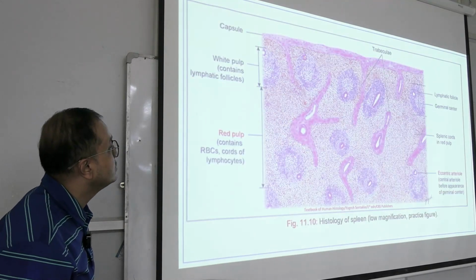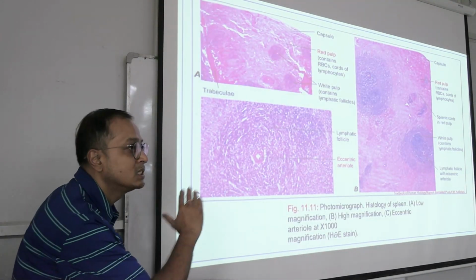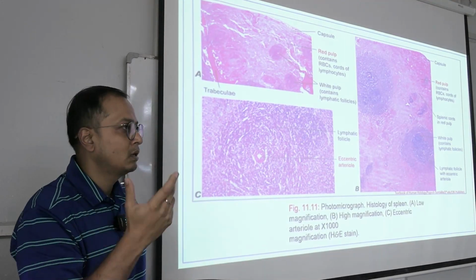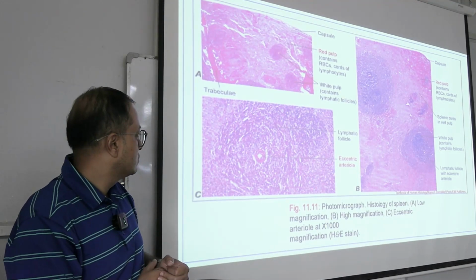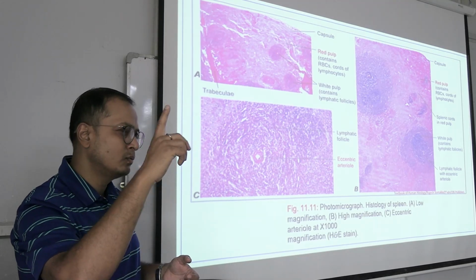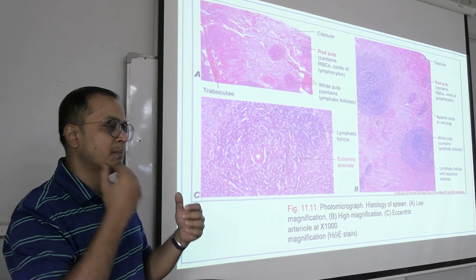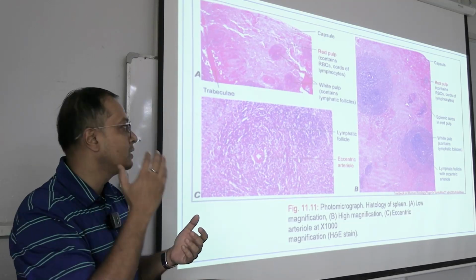So definitely these two tissues are different and can be easily differentiated from each other by identifying them. We have, unfortunately, only one slide for the spleen tissue; the other one got messed up yesterday, or some day before, in some other class. So till we find something new, we only have one spleen tissue with us and plenty of lymph node tissue. They are projected there. Please do not move the slides. Take the picture and see whether you can understand the difference.